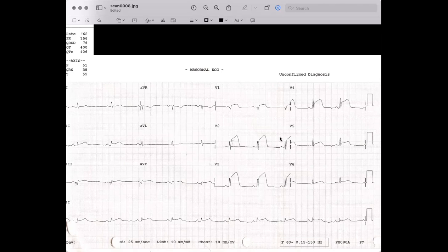It is a very large infarction, which means that one of the vessels, the left anterior descending, is really very large. Probably it's the one occluded, and it wraps around the left ventricle and goes back, covering the inferior wall. That's why you have both territories involved.